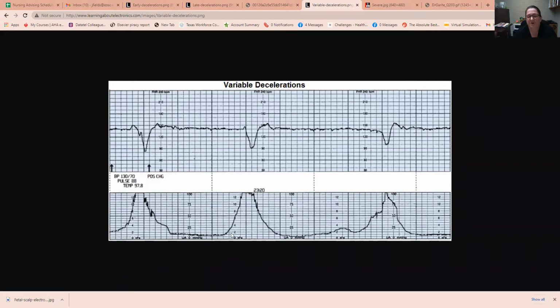But when we look at these contractions, I would wonder what this patient's exam is, because these contractions appear to be pretty high and even squaring off at the top, meaning that they're going past the ability of the meter to read that. That may be because they have an external monitor on, and they could still be 2 centimeters and contractions look like this on the external monitor. But they're fairly close together also and lasting a decently long time. So I would want to know how close this patient is to delivery.